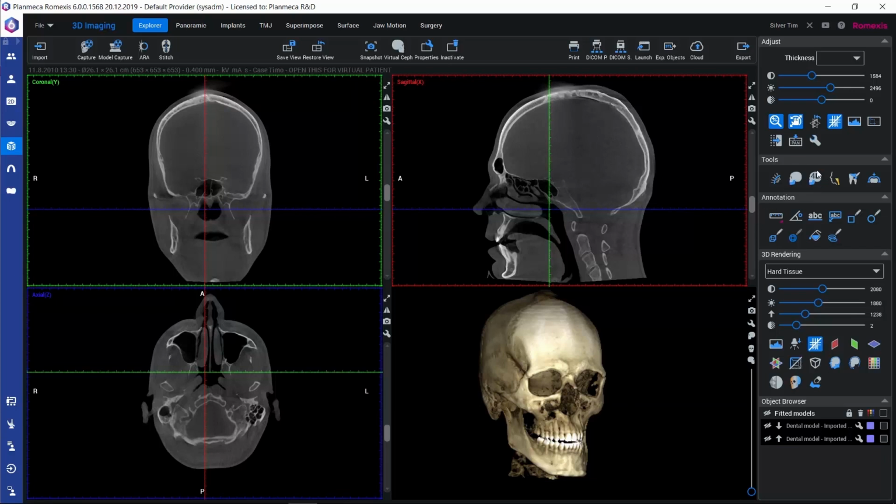If we also have 4D jaw motion included in our license, we also have this other icon here next to our jaw segmentation tool. But in this tutorial, let's activate this normal jaw segmentation tool. The other one would follow the 4D jaw motion process.